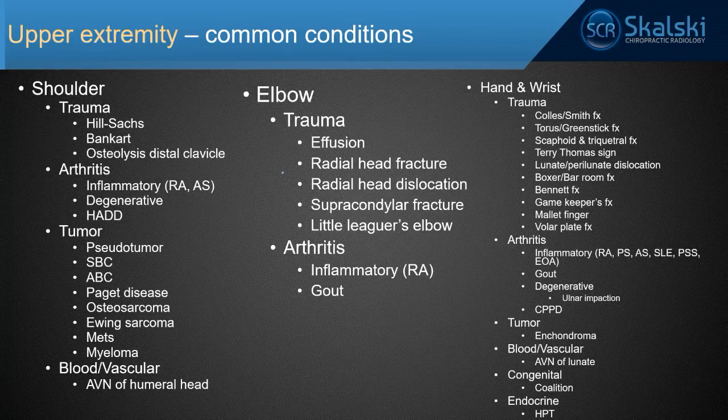All right, so we're on to the upper extremity. Again, I just kind of off the top of my head threw on a bunch of random conditions here, to try to get cases, at least one for each of the things listed on this slide that are likely to pop up on boards. And so we're going to buzz through about 60 cases here pretty quickly because it's about 2:30 a.m. and I need to get some sleep.